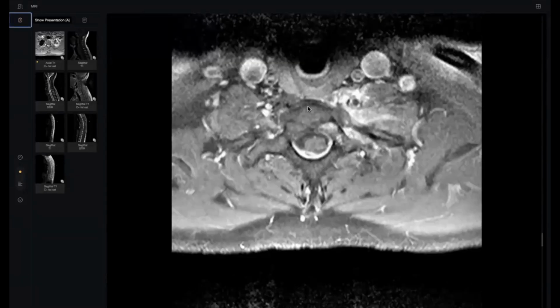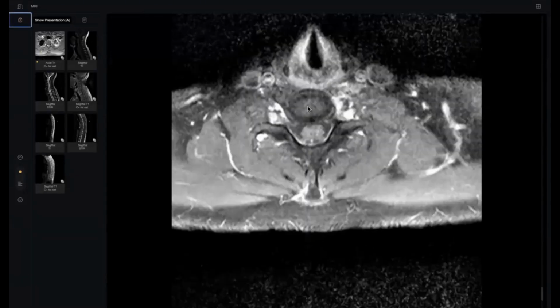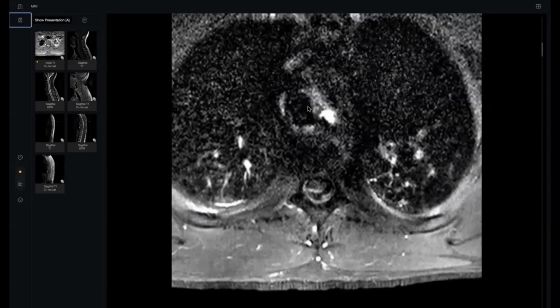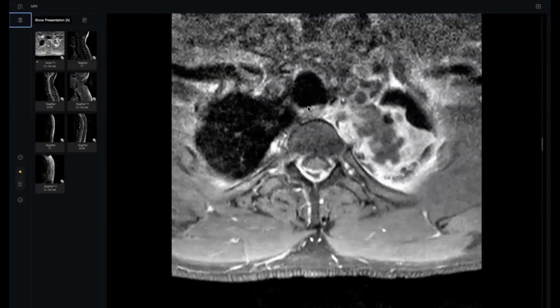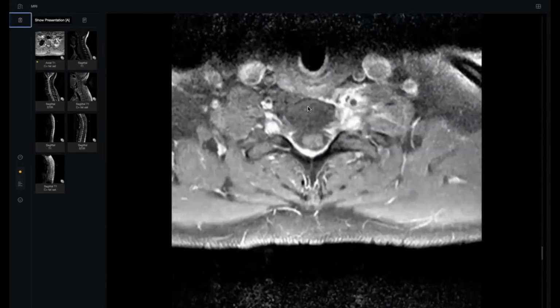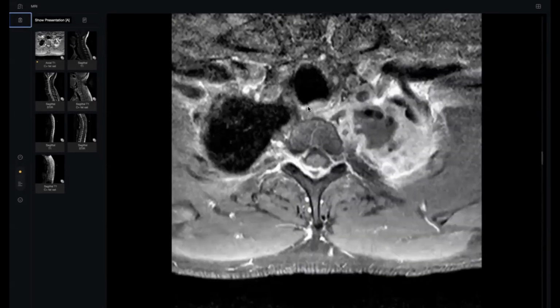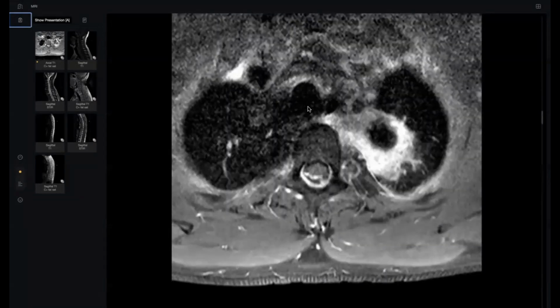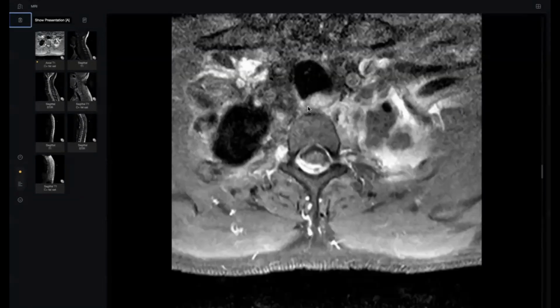Please. A 35-year-old male patient complaining of weakness of both lower limbs. This is an MRI, T1 fat-set axial section, in a patient who has complained of acute lower limb pain. I can appreciate diffuse swelling of the cord. There are some heterogeneous internal hyperintense changes within the cord, extending from the center to the periphery, sparing some of the anterior part of the cord.